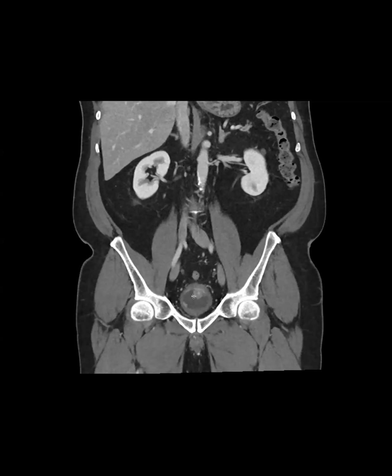And I think if we wanted to reduce radiation exposure, perhaps dual energy could be something so that we could just create a virtual non-con. But I do like having venous phase on my urogram for this reason. Definitely.